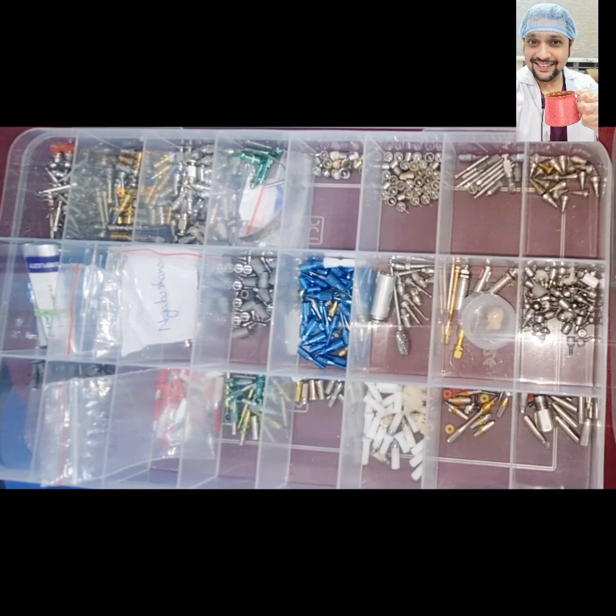And there is a very simple presentation on basic implant prosthodontic components. So I'll explain all those things in a while. So enjoy the presentation. Now, this is the display of all the components when it comes to implant prosthodontics. This is a simple display of many components.